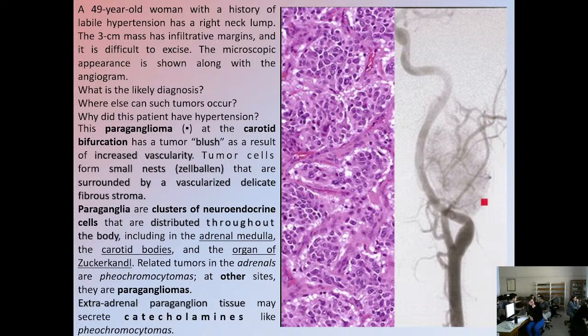So, morphologically, they appear the same. So you perform immunohistochemical stains against neuroendocrine markers, they are positive. So this is neuroendocrine differentiation. Stains for epithelial derivation are negative. So it's not a carcinoid. Next case now.